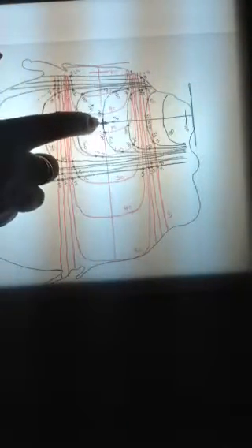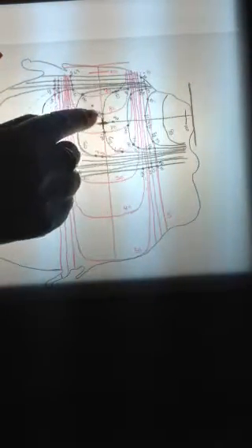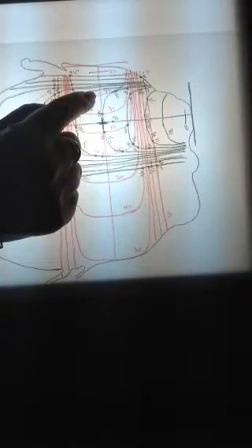Then we're going to have to see if any of the dose lines that we've added connect to each other. So for example, here's a point of 140, 140, 140, 140, 140, 140. Almost seems like it makes a pattern. But before we do that, we have to decide if these 140s connect, if there's any place where we don't see intersecting points, is there a 140? So right here, for example, between 80 and 90 for the red would be 85. Between 50 and 60 for the black would be 55. 85 and 55 is 140. So there's a 140 there.